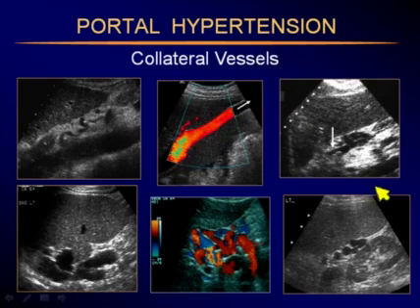In this image, we see the splenic vein, which is posterior to the body of the pancreas, and it seems to have a branch. We usually never see a branch there, but when we see such a branch, that's a perfect place for a coronary vein. Here's a spleen with large vessels around it up in the left upper quadrant. Perhaps these are gastrosplenic collaterals. Here's perigastric or perisplenic kind of collaterals. Here's a large spleen with the left kidney, and there's a large tortuous vessel in between, a splenorenal shunt.